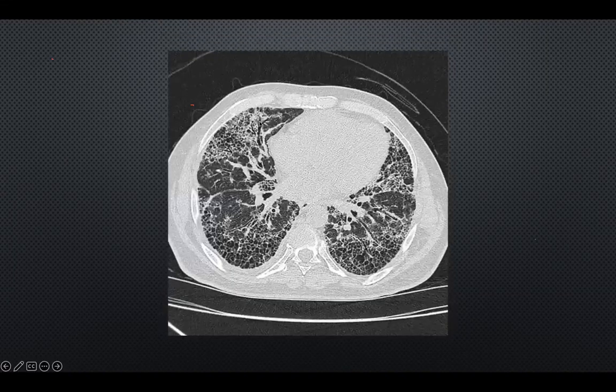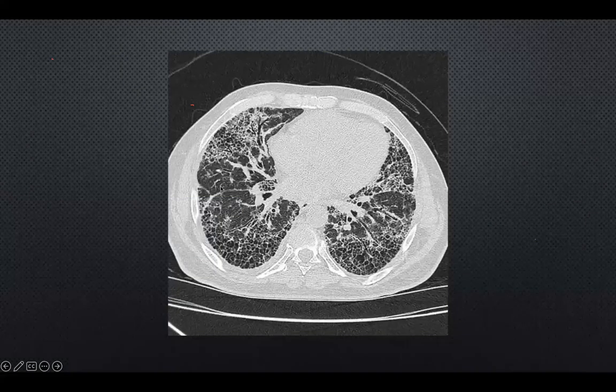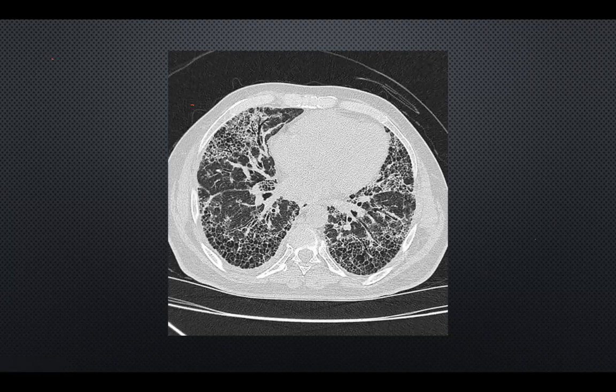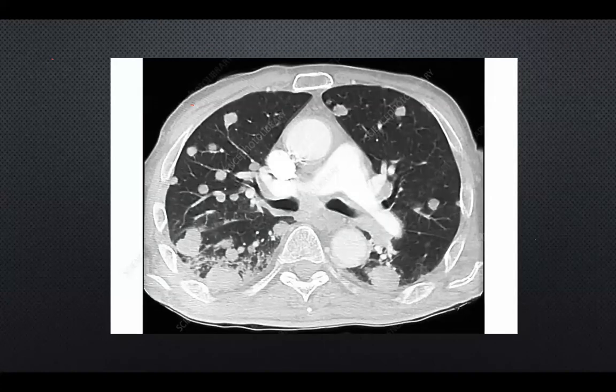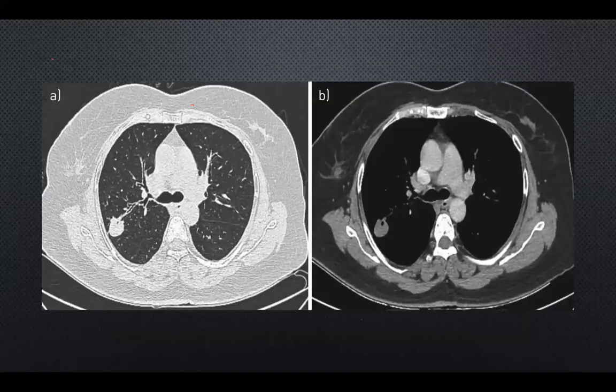And then this one is an example of florid fibrosis. It's a HRCT, florid fibrosis, most probably idiopathic interstitial fibrosis. And then this is very, very white opacities that are across both sides of the lungs, various sizes, quite round, and we call these cannonball metastases.